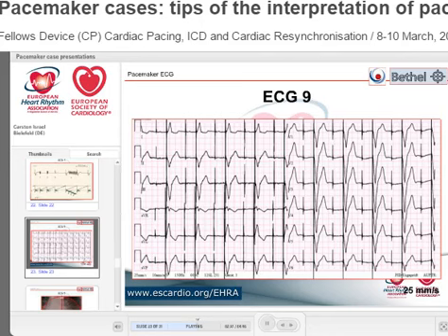Somebody says the ventricular paced beat looks like a left bundle branch block. Left bundle branch block, I have learned that it's an S in V1, but then there is a large R in V6. I don't see it. I see an S in V1, 2, 3, 4, 5, 6. So the thing is, what I want to tell you, is this left bundle branch block? Yes. For left bundle branch block, the definition is only V1.